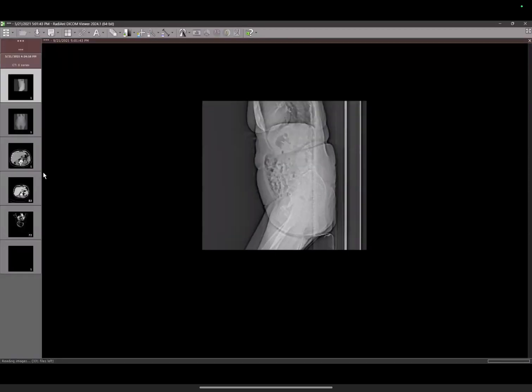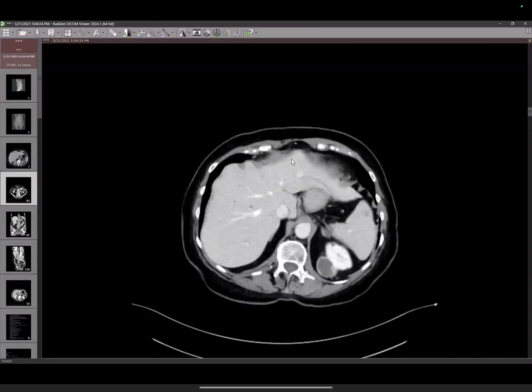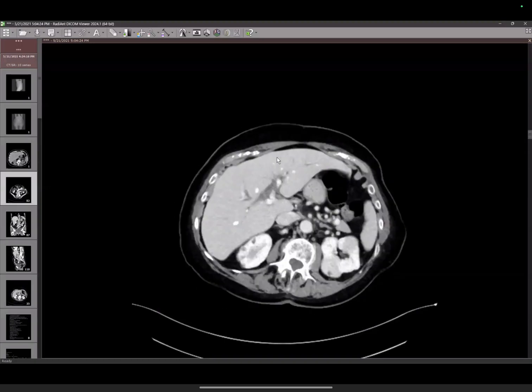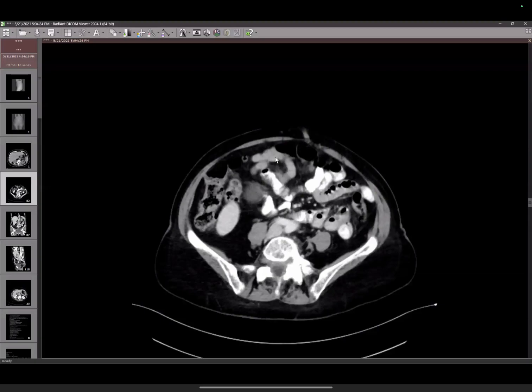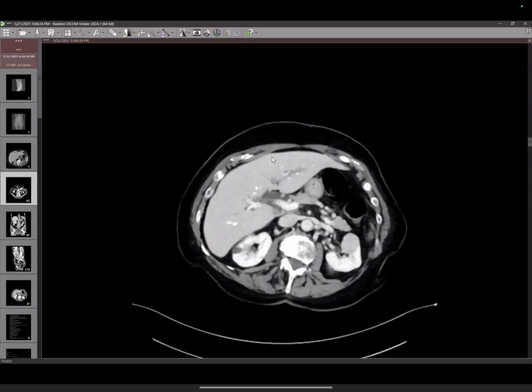So, Suman, we will take it. Yes, take me. We will, all of us. You all can do it together. So yes, here, these are the images.